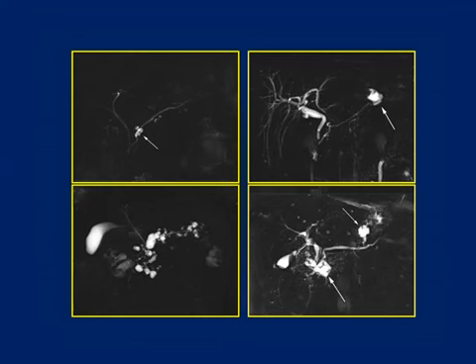The explanation of this mild dilation may be two causes. One is that it could be an associated mixed IPMN. That means that the IPMN involves these ducts, but also the main pancreatic duct. But an alternative is that the mucus produced by the IPMN goes inside the main pancreatic duct, and the flow is obstructed by the mucus, so the main pancreatic duct is relatively dilated for a sort of sub-obstruction.